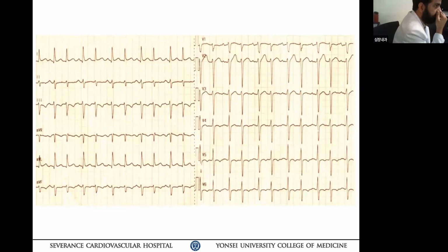So first of all, I appreciate the fellow bringing up this very interesting ECG, and moreover, I'm very happy the fellows suggest so many different differential diagnoses; it is a brain exercise. I don't think we can make a conclusive diagnosis from a single sheet of ECG, but we need to try to find out the mechanism. As Dr. Huang mentioned, there is some irregularity, but it is not apparent.